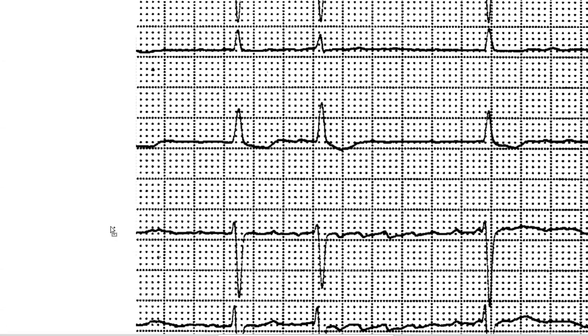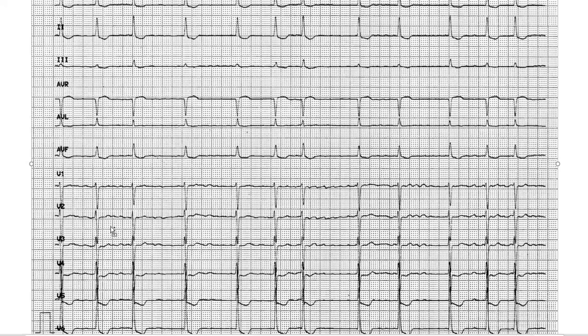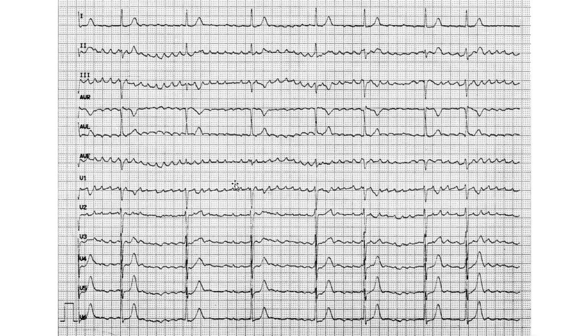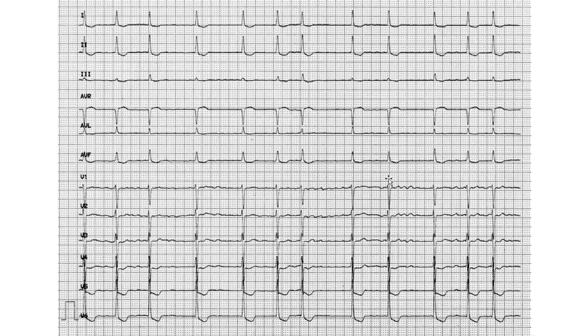Again, they're not robots, so they won't mind. But typically it's not that much of an issue, the idea of fibrillation versus flutter, because flutter is very textbook looking. Look at this example, it's very clearly a sawtooth appearance. Fibrillation is typically quite hidden and quite chaotic, you could say. It's quite unstable. Here it looks like one thing, here it looks different. You'll get what I mean.